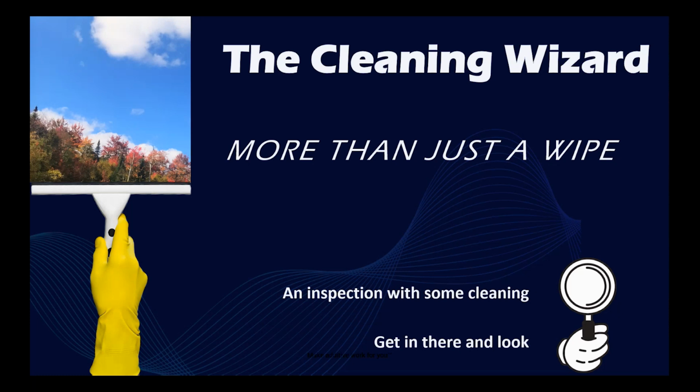But really, it's checking for trends, things moving in the wrong direction, cured material where it shouldn't be. It's to get you familiar with the printer so you know what it should look like. And then when you have something that is where it shouldn't be, it's very easy and quick to know that you have an issue. So the cleaning wizard is the number one tip that we have for great maintenance of the printer.